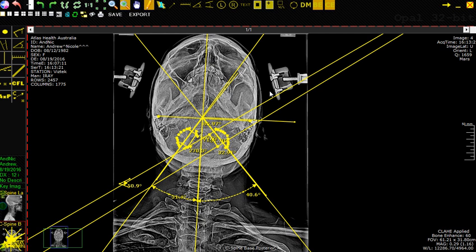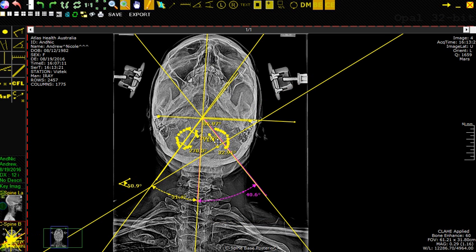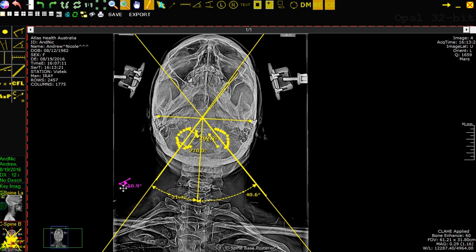That's good right there. So I think you can see just how messy all of this starts to get. I could go in now and I can start to delete all of these different lines. So I could probably delete that line, or I could do this one at a time. I could delete this one annotation here if I wanted to, but it still is messier than we would ideally like. Let's say I even was to delete that one. Because the point is when we analyze our normal Blair films, this is basically what it looks like right here.